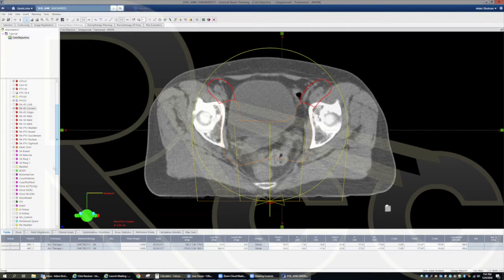And then I did it on this case, honestly, just because they were already in here for me. Typically, if I pull up the bladder, for example, I'll usually just optimize on the bladder without creating any additional structures. The fact that I have these edges allows me to lower the DVH on the bladder and still keep my PTV coverage. So that's a viable option. Or, if you want, you can do Boolean operators and subtract out the parts of the organs outside.